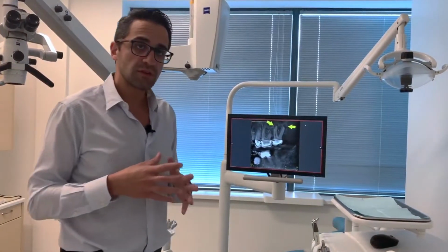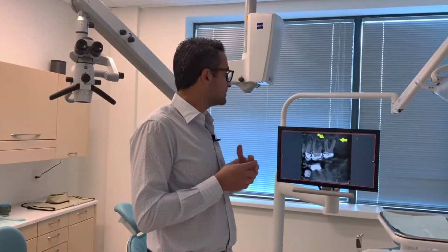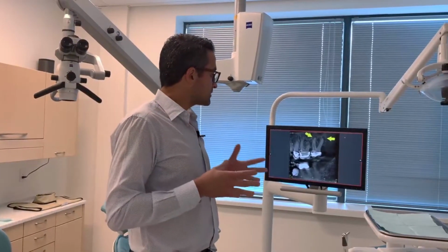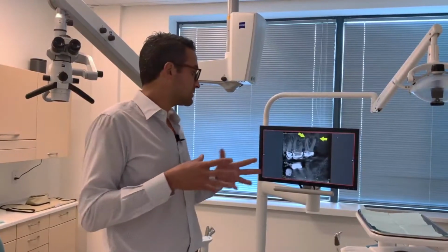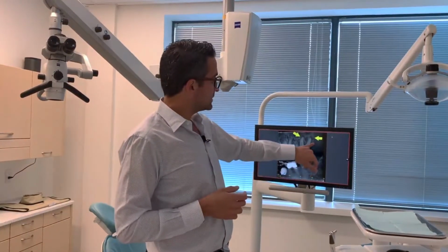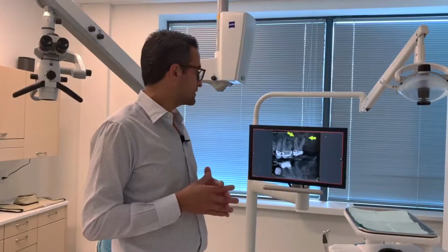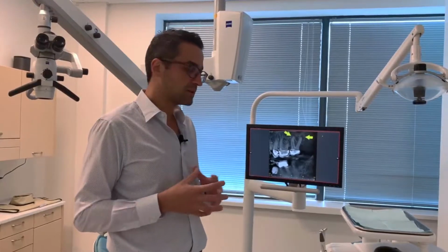Now I inspected the tooth on CBCT to see if there's something else in there that could explain the development of these lesions, other than, of course, the logical reason, which is having a crown on the tooth. I was wondering if maybe the tooth is cracked, but I wasn't able to see that on the CBCT. But I had warned the patient that the tooth might be cracked, seeing that there's some bone loss on the distal here. That can sometimes signify that the tooth is cracked, and the tooth has a very old crown that has been worn down, so the tooth has served a lot.